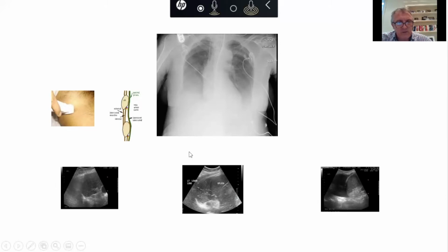However, from this chest X-ray, this is what you can see. So this is the spleen here, and the lung has become solid. And what we have here, these branching bright areas, are air bronchograms in consolidation. We've lost the hemidiaphragm on the left, and we have consolidation. So ultrasound can differentiate between normal lung and consolidation. This chest X-ray could also represent fluid.